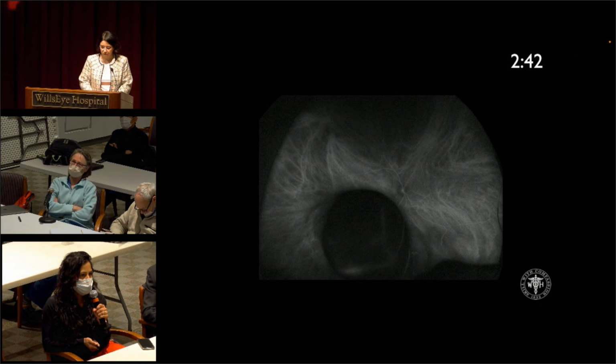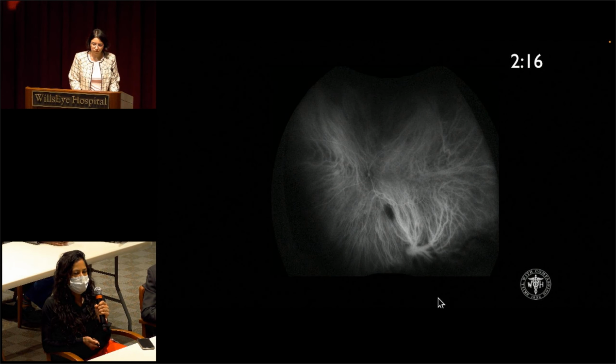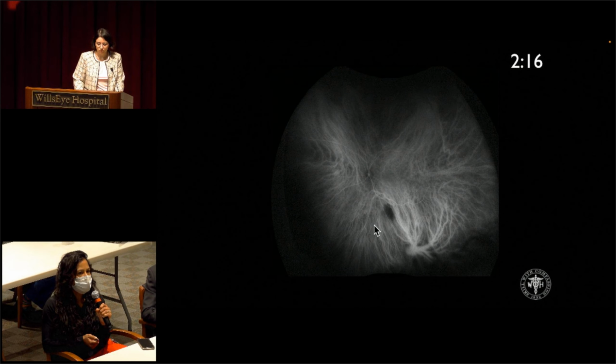Yeah, and then a later frame, 2 minutes and 42 seconds, similar pattern, kind of this large area of hypofluorescence. And then 2 minutes and 16 seconds in the left eye, overall good choroidal fill here. We see this area of hypofluorescence correlating to that choroidal nevus.